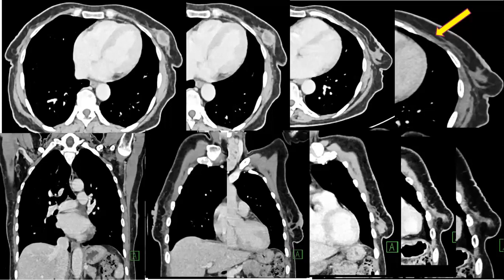But we have to be cautious, especially if the lesion is abutting or close to the nipple, search for nipple involvement. If close to the pectoralis, search for pectoralis involvement. If close to the chest wall, this is at the apex of the pectoralis, the lesion.